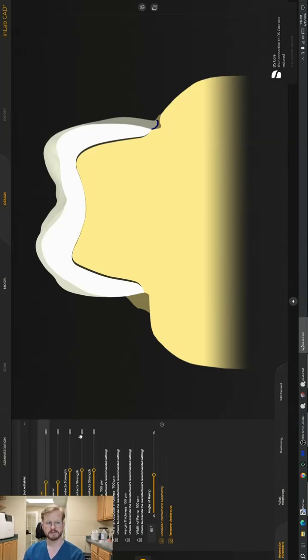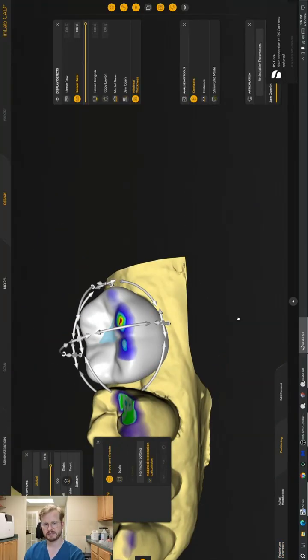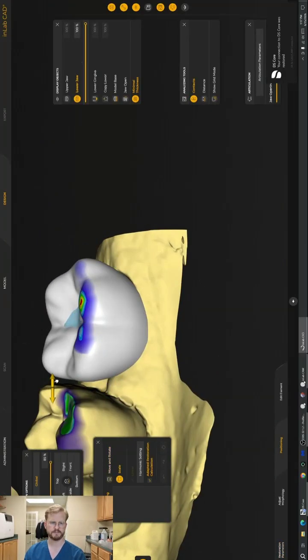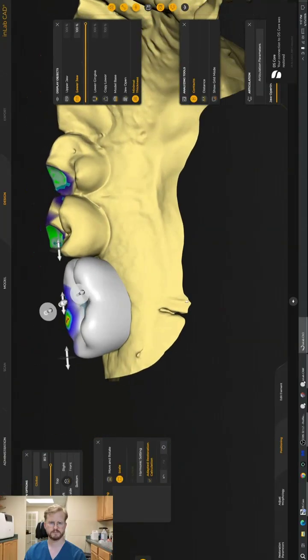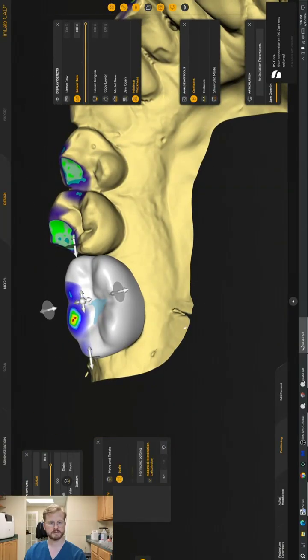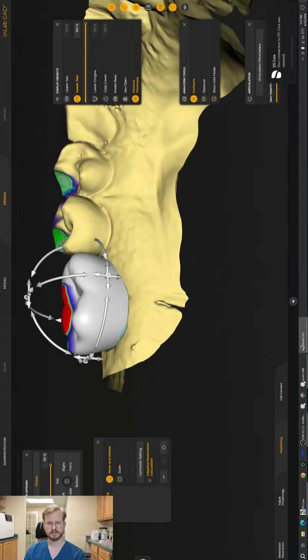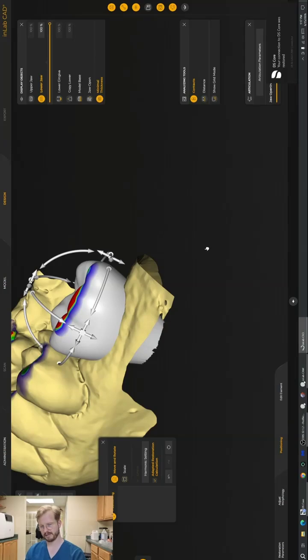So all these parameters are going to stay the same. We're going to lute this. We're not going to be bonding to titanium, so 80 micron spacer is plenty. We will check our positioning tab just to see approximately where it wants to put this thing. All right, that looks pretty decent. We can make this a smidge taller. And then we'll edit element.